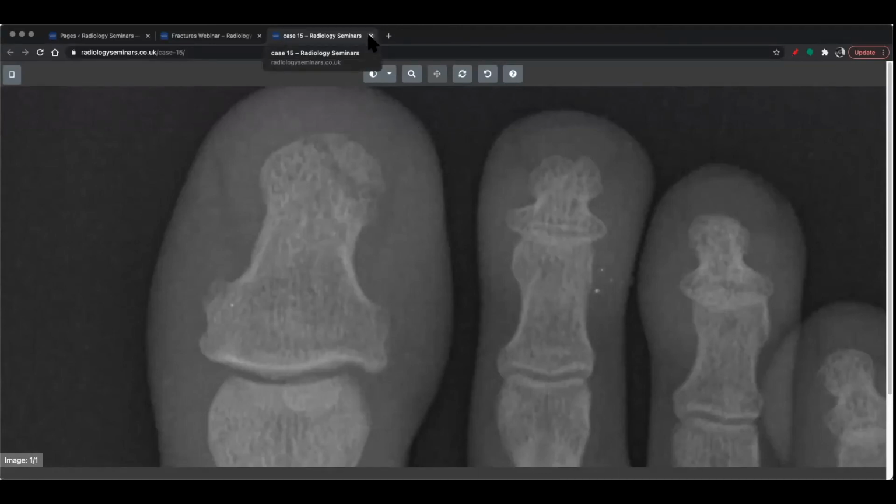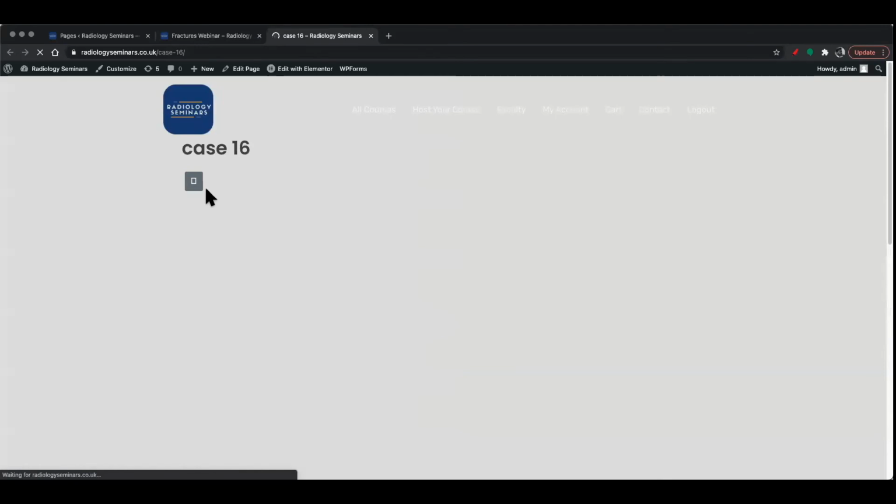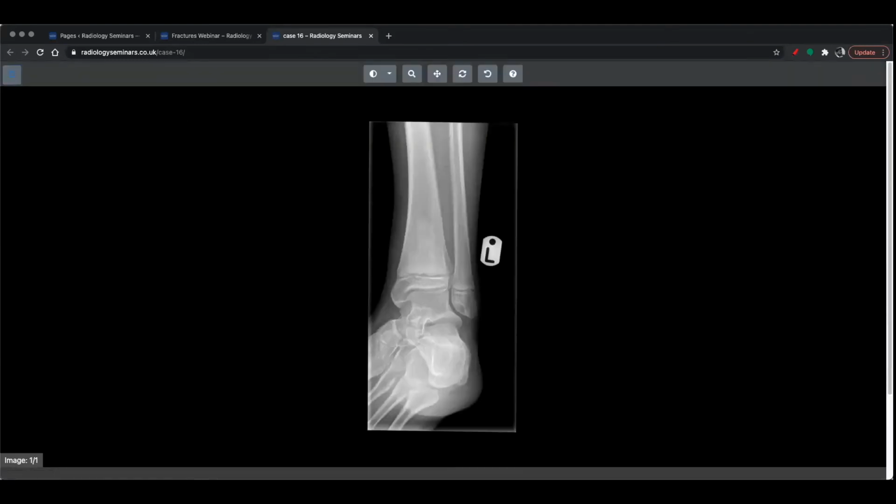And, you know, not seen. Some people don't look that far into the terminal phalanges or terminal tufts that often and end up missing these things. So something to be aware of when you're doing it in practice. But, you know, just use those check areas. So I've kind of taken a step back. Hopefully it's a little bit more straightforward on this one.